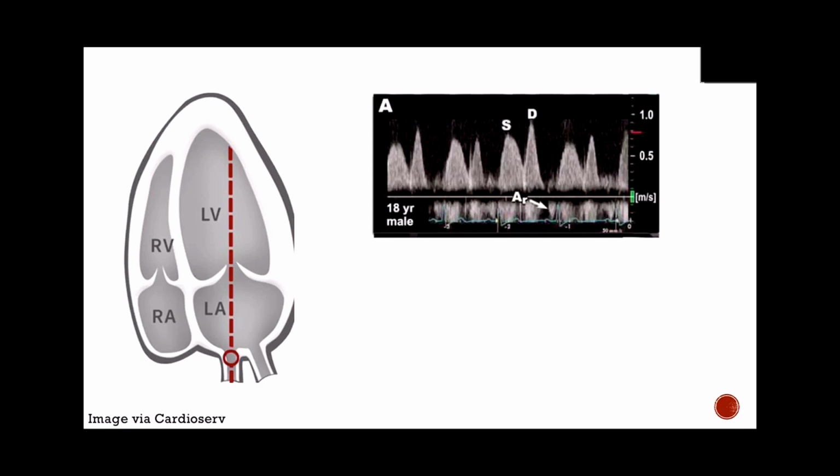Now, pulmonary vein flow. I will be very honest with you in saying that this is not used very often in critical care medicine. Okay. In the echo lab, the pulmonary veins are usually only visualized anywhere from 60 to 80% of the time. And that's in normal, non-critically ill patients in the lab. So in the ICU, getting this view is going to be a little bit harder. And so it's not used very often in clinical practice. I'll admit, I very rarely use it.